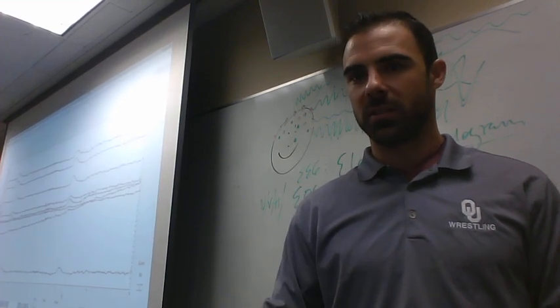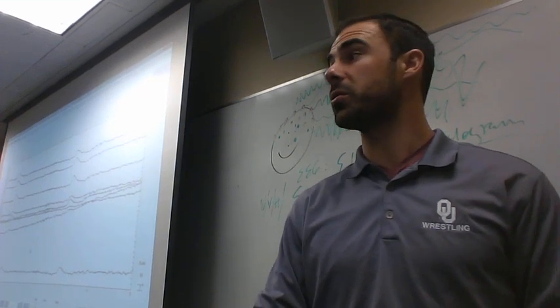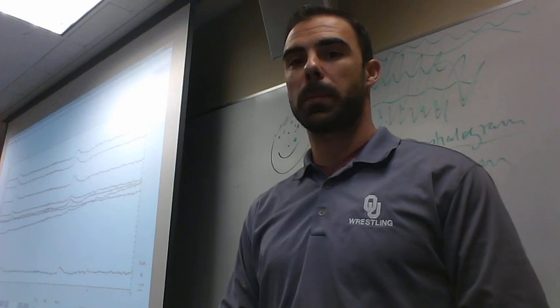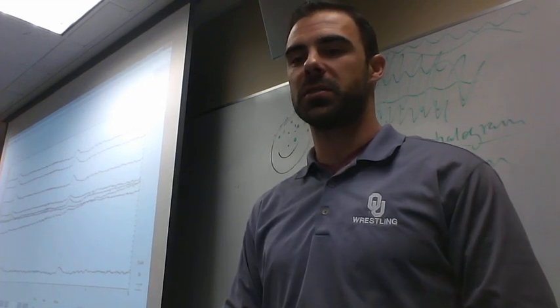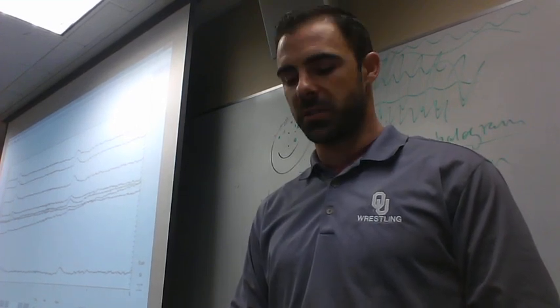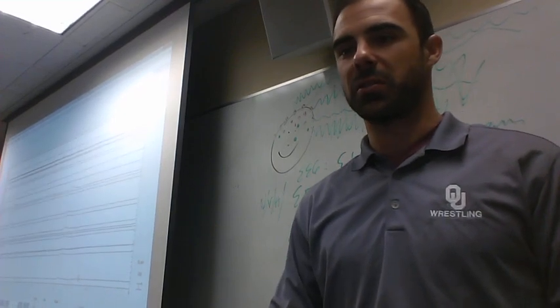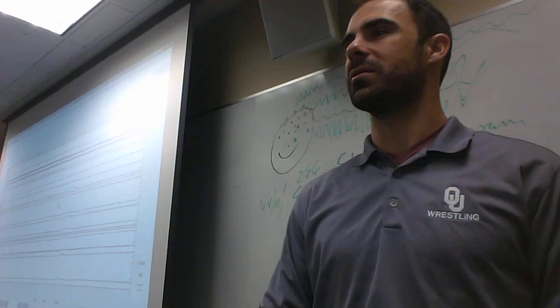Okay, and so what we see here looks a lot different than what we saw last class, doesn't it? Okay, we have our electrode sites here, but the scale here is very different. Let's type in, I don't know, I'm going to put in like 400 maybe. So now I can start to see all these other channels.